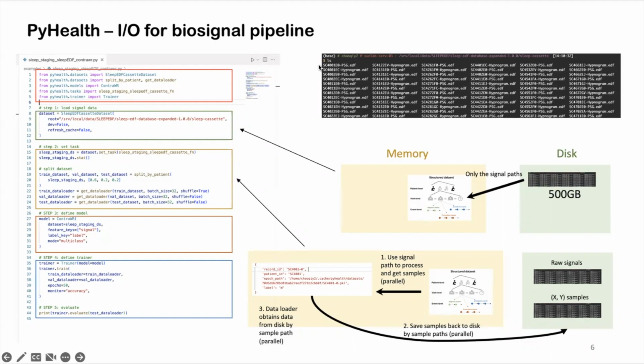And there is another associated file, it's called hypnogram. This is the annotation file for this EEG data. So if you want to process the data, these two files have to go together, the PSG file and the hypnogram file. And for other data sets, they probably have different ways to store the data, but usually they will store different recordings separately in different files, just like this.